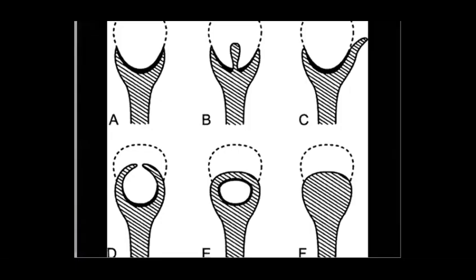So this patient was diabetic, yes. And they have many appearances. So this one should be the normal.